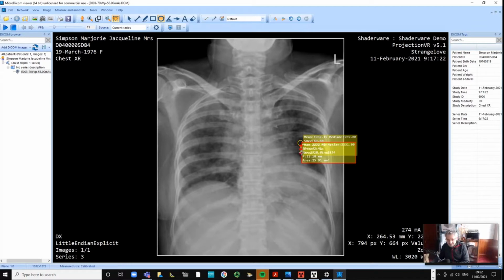No, that's not what I want. Delete. I have to pick it. That's the pick button. Pick, Control C, Control V. Let me move it? Yeah. Okay, so that's not very good, is it? Right, let's go over here. Let's go to here so we can see them.